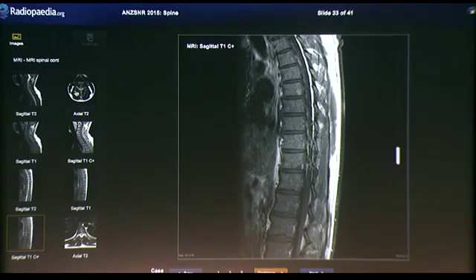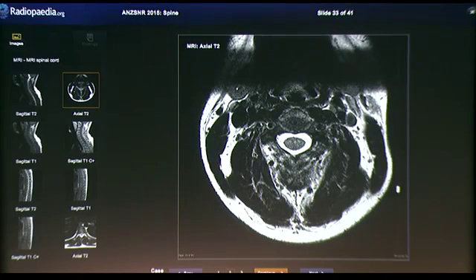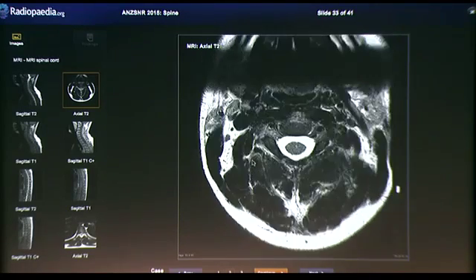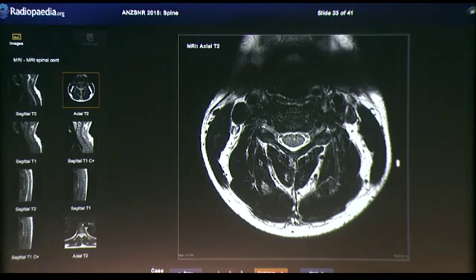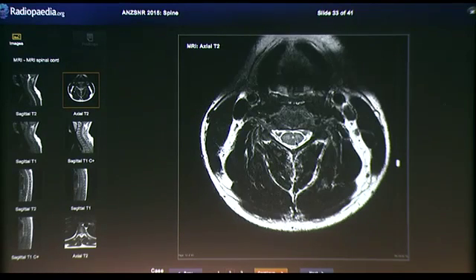So anterior horn T2 hyperintensity has a differential. These areas are metabolically active and at risk for ischemic insults. But this particular patient didn't have an abrupt onset. It was a progression over a few days. He's a bit young for most cord infarction, and he has this history of a febrile illness.